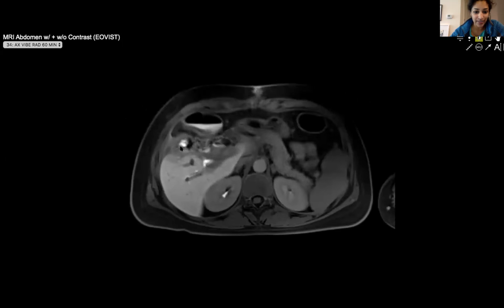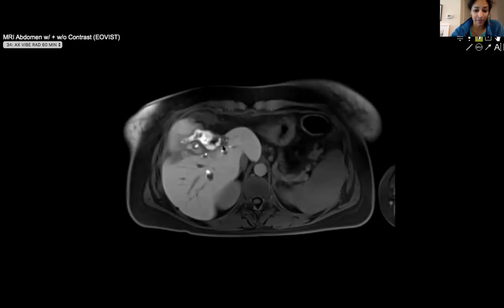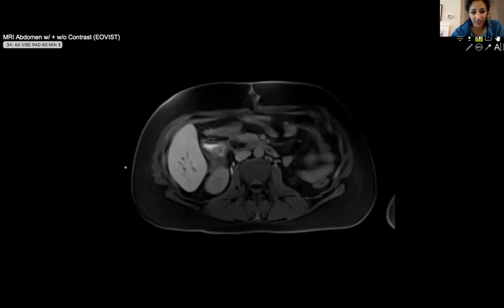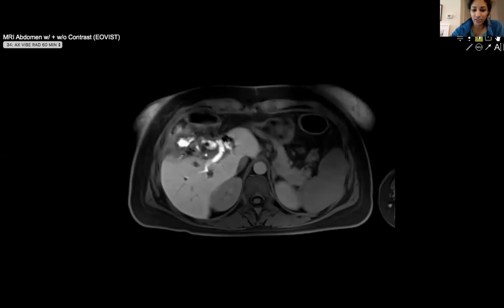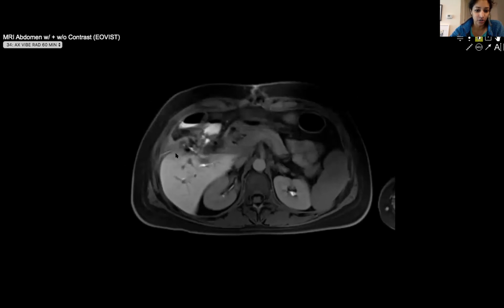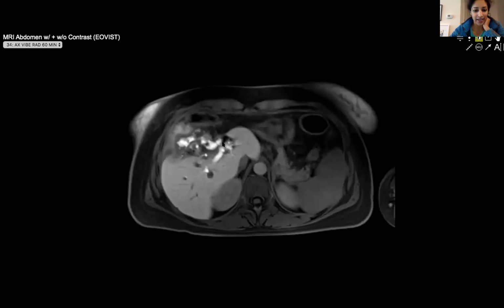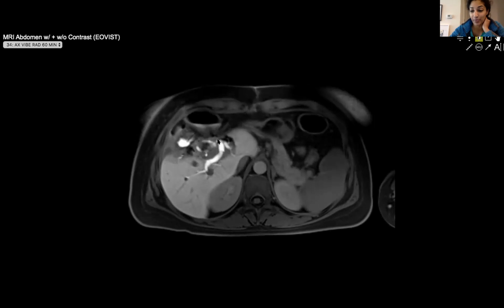They had a drain in place, and they also had an ERCP, like a common bile duct stent. And you can see that actually here's the CBD stent, and none of the Eovist is going in the CBD stent or into the duodenum. So basically, it's almost like a transection of the right biliary duct that is going into this biloma. There was high biliary output in our drain, and there's also this fistulous communication. So what they're planning to do is go back in and basically resect, kind of debride all of this, and then pull up a jejunal loop and connect it to this right bile duct.